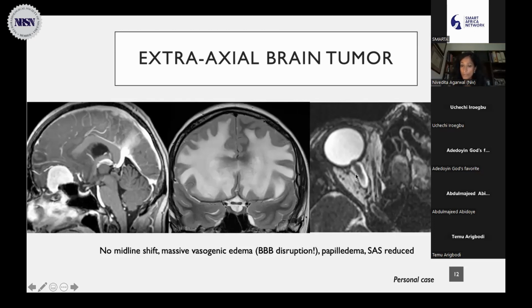So you have the optic sheath that is enlarged, and you can also see protrusion of the optic disc. And that is because there is no hard structure here, it just gives. And so now you can see how the optic nerve is being pushed. Many times these patients will just come because they have visual loss, for example, right? So see how a tumor can affect optic sheaths.